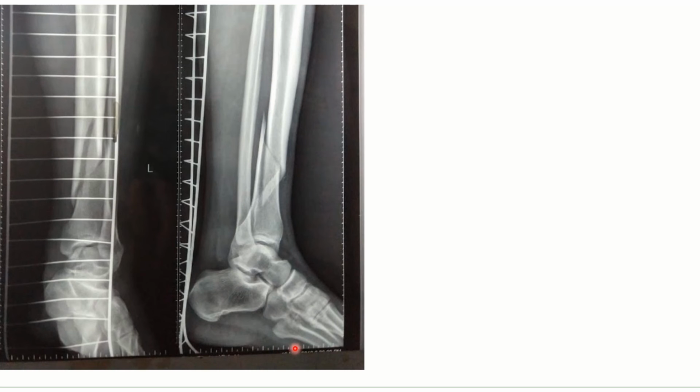So again, another X-ray here. Patient name and details I have deliberately not put for privacy's sake. So this is a mark here showing a left side. Again, this is not a complete X-ray because you are not able to see the proximal leg. There could be a fracture that would be here. So you always have to have the complete picture of the X-ray.